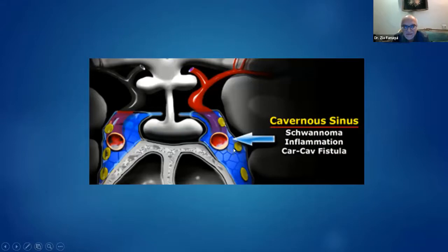So we've got the trigeminal. Okay? So we have 4 cranial nerves which run through the cavernous sinus. Okay? We have the 3rd nerve, we have the 4th nerve, which you're not seeing here. Then you have the 6th nerve, which is the most medial and posterior to the pituitary fossa, and then you have the V1 and V2 segments of the 5th cranial nerve. The V3 segment passes below through Meckel's cave.